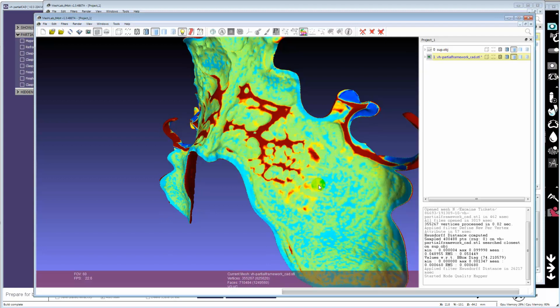Okay, I hope I didn't cause more trouble than I solved, but especially the clasp rest is a good trick, and also be careful with your imported parts. And if you really feel very comfortable with changing your material settings or your auto relief settings, depending on what material and fabrication process you're using, you have a little bit of indication how to do that. I would recommend only doing that if you really have some problems.